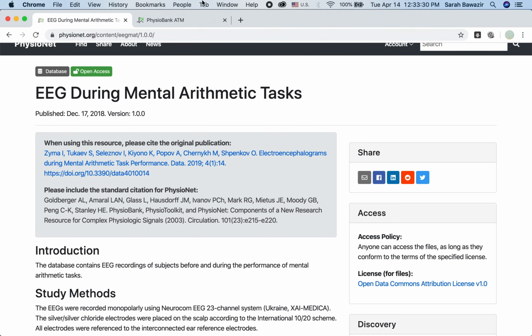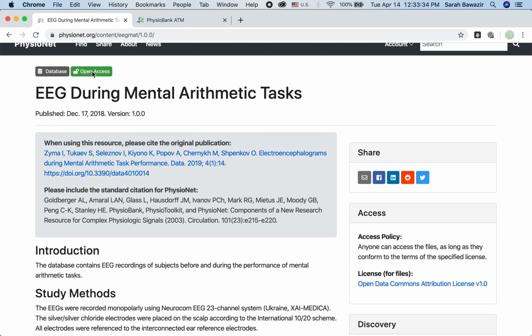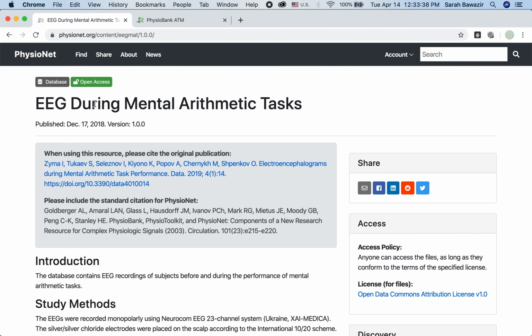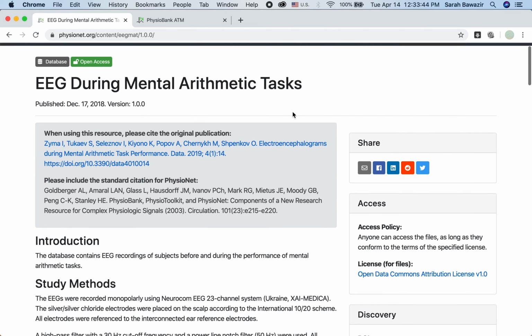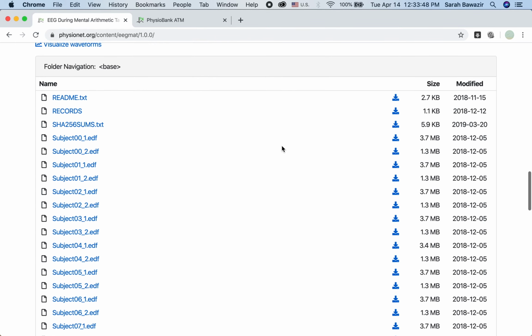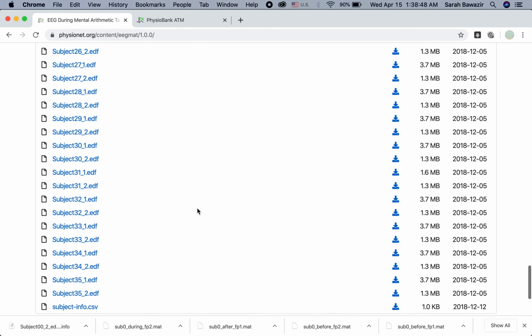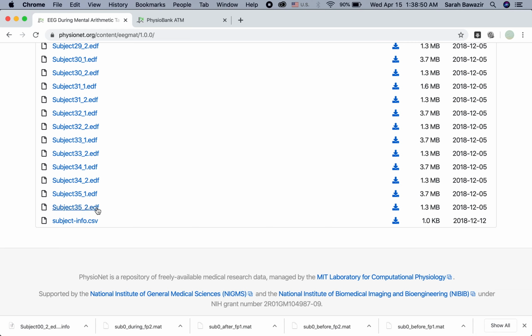Hello, so in this video I'm going to show you how to use the PhysioBank ATM to download data from a database on PhysioNet. For example, we're taking the EEG during mental arithmetic task database. And again, as you may be familiar, the data is all here in a .edf format. In total, we have 36 subjects, and for each subject, we have 22 signals.